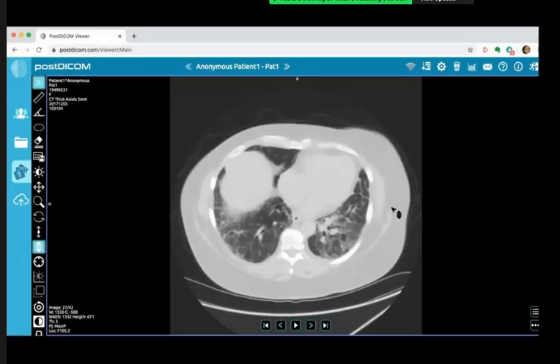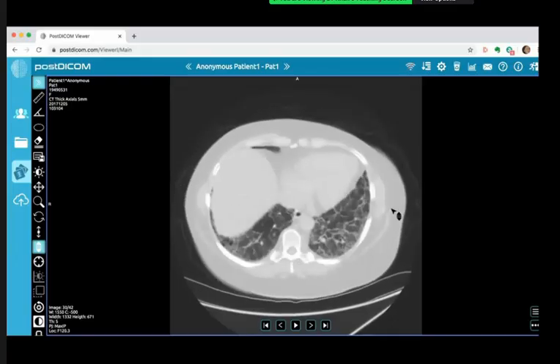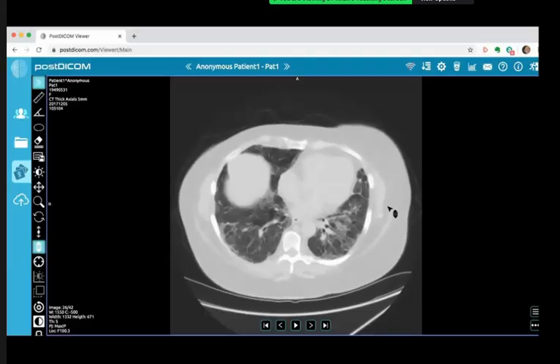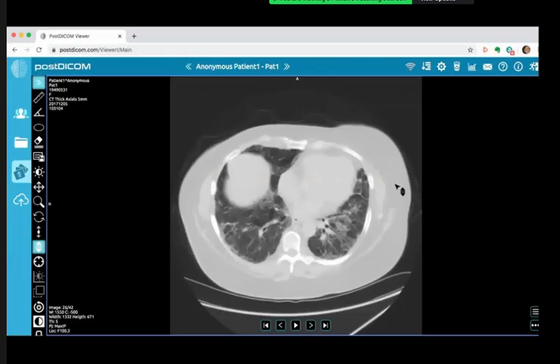And I think putting these together with regard to some minor nodularity and the reticulation together with the mosaic attenuation, I wonder if this patient has some form of pneumonitis. If it's lower zone and more nodular, I think it might be acute hypersensitivity pneumonitis. But there's a lot of fibrosis as well, so it could be a long-standing thing.